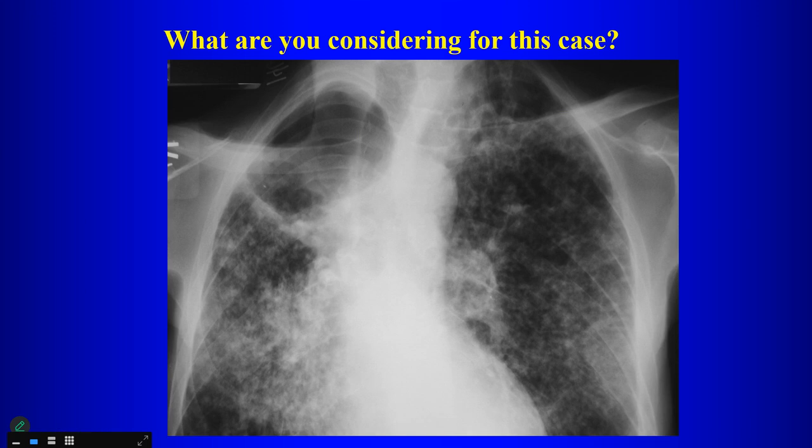And what else do we see? I can't hear you. Well, what do we call these things? What are we gonna call these guys? Calcified granules? No, those aren't calcified. Nodules. This is not calcified. Do they look more nodular or reticular? Nodular. So these are nodules.